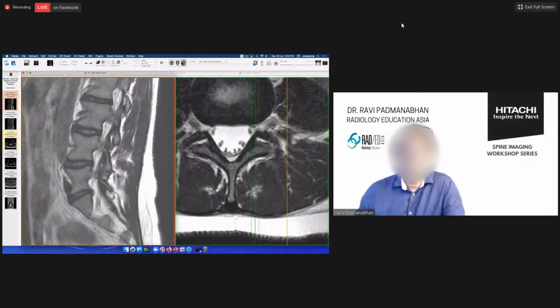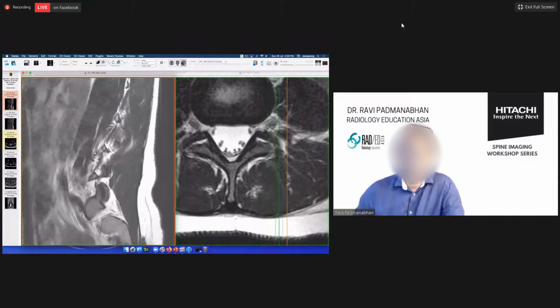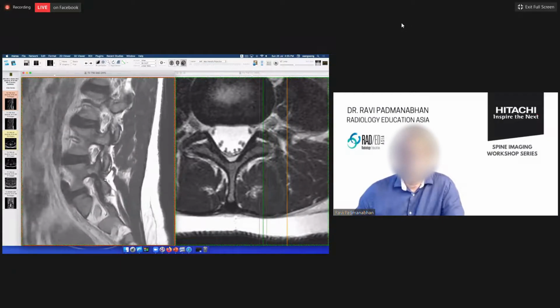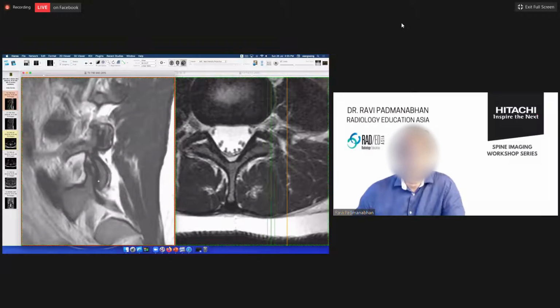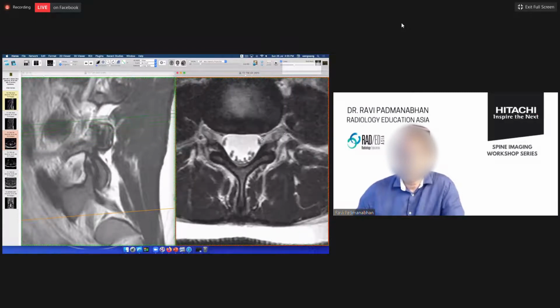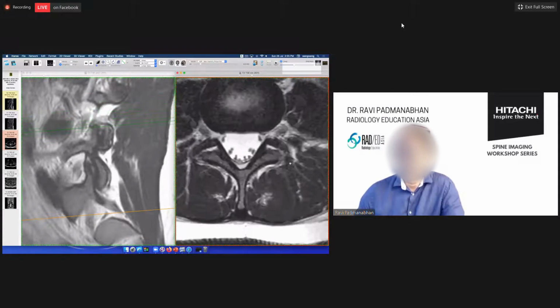And then as we keep going more laterally, we're right into that facet joint. So we're now looking at the foramen to see if there's any cystic structure. And then as you go out as far laterally as possible, look for cysts out here. Also look for cysts in this posterior aspect of the facet joint. And when we look at the axial images, where are we going to look? Those same places again: subarticular recess, foramen out laterally, and also at the posterior margins of the joint.